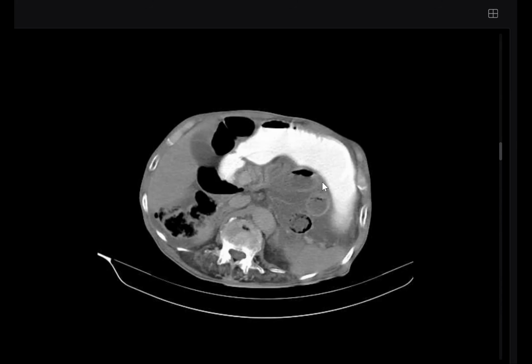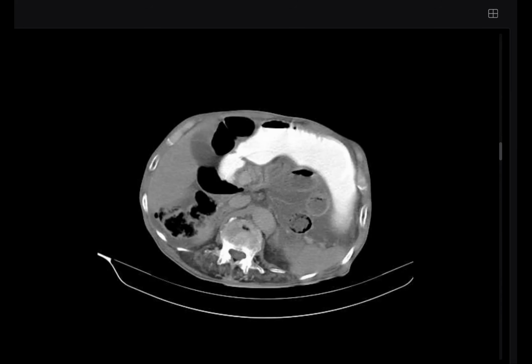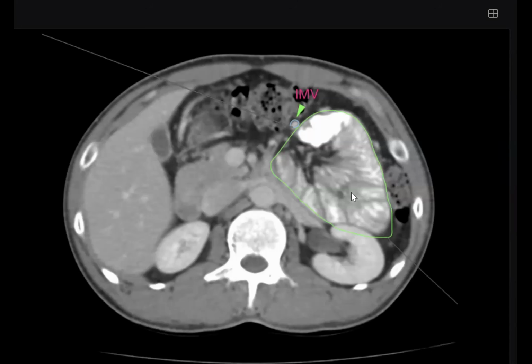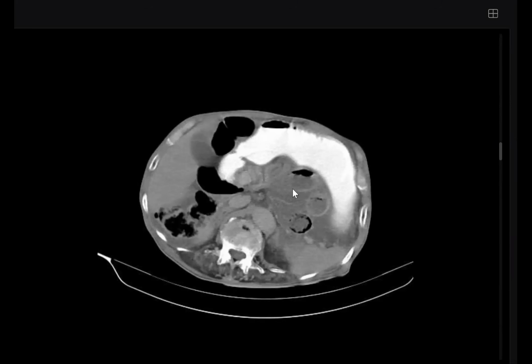Look at the periphery and the location also. The periphery, if you see lobulated outline, no sac around. And of course, higher location posterior to the stomach. But this hernia, it's contained within a sac and lower down, below the level of the stomach, in addition to the vessels. So this one is paraduodenal hernia, and this one, lesser sac hernia.